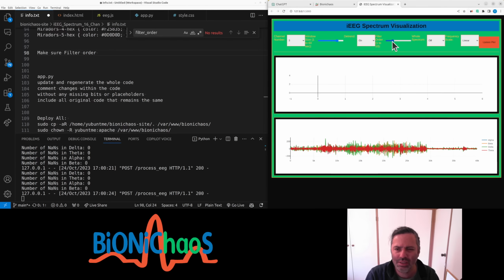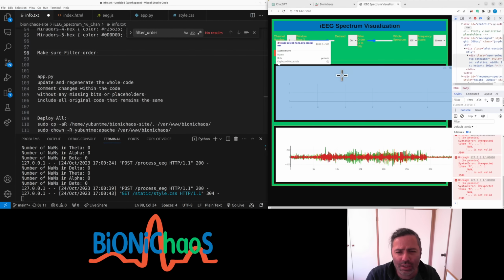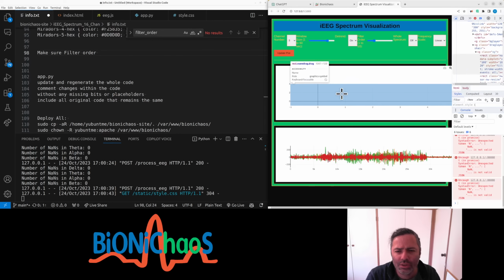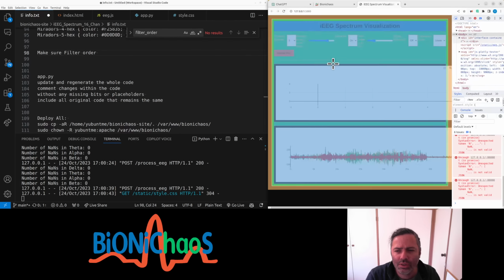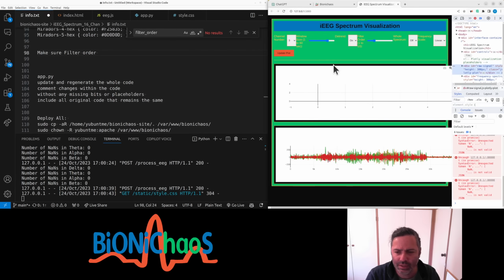Okay. Yeah, what's the first? This chart is called raw signal. So why am I not seeing the raw signal?